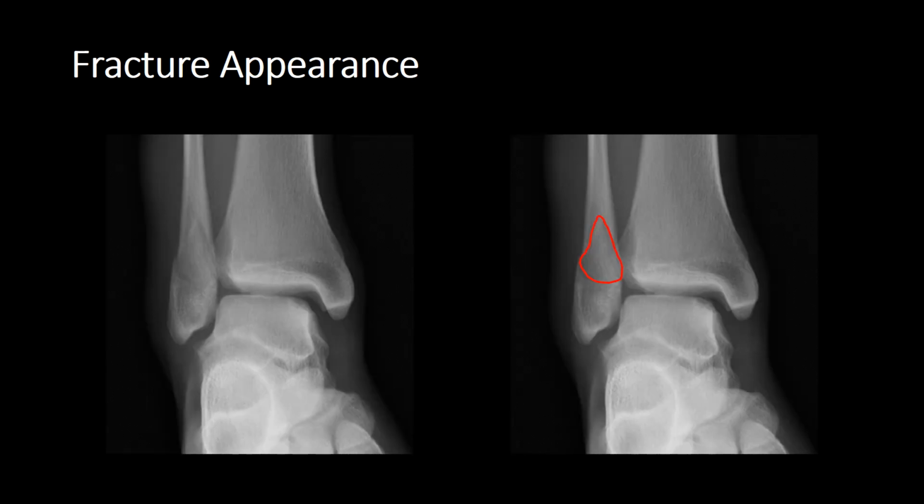Because the fracture line is lined from posterior to anterior, anterior to posterior, depending on which way you look at it, you're not going to get that horizontal line on your mortise view. Instead, what you get is a kind of ring effect as you see it en face. So if you see this kind of odd appearance on your mortise view, you need to be really suspicious of an oblique fracture running posterior to anterior, and so scrutinise your lateral view very carefully.